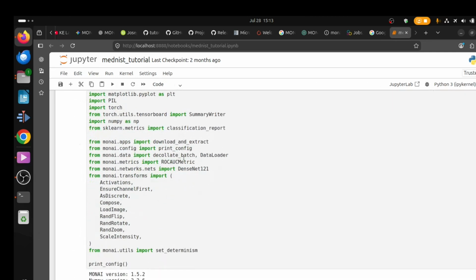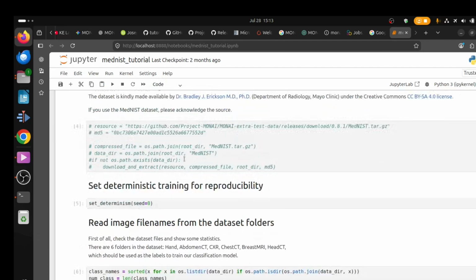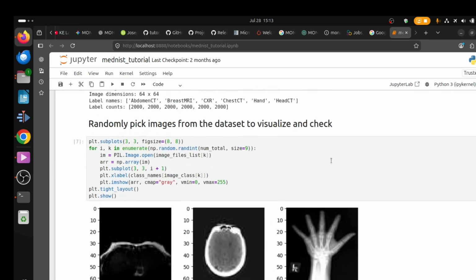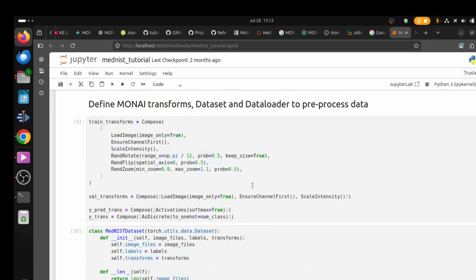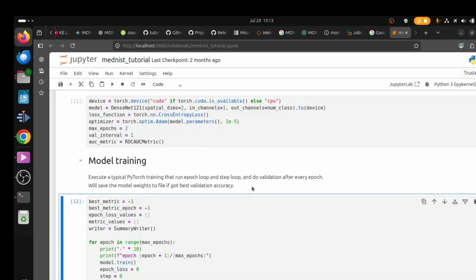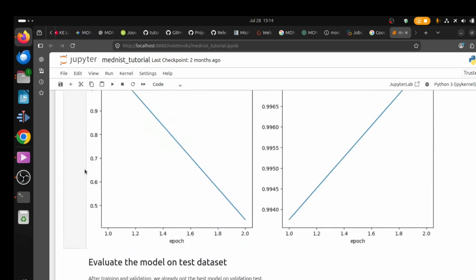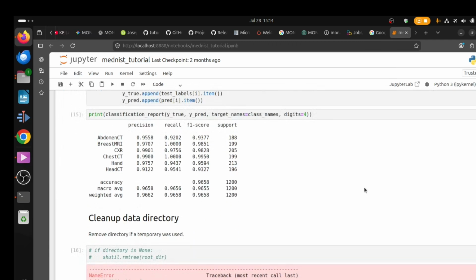At this point, I am not starting a new training run. What you are about to see is the notebook and the results from an experiment that I actually ran in May 2026. I am revisiting the notebook so that I can walk you through exactly what I did and what happened when I trained this model on a CPU-only laptop.